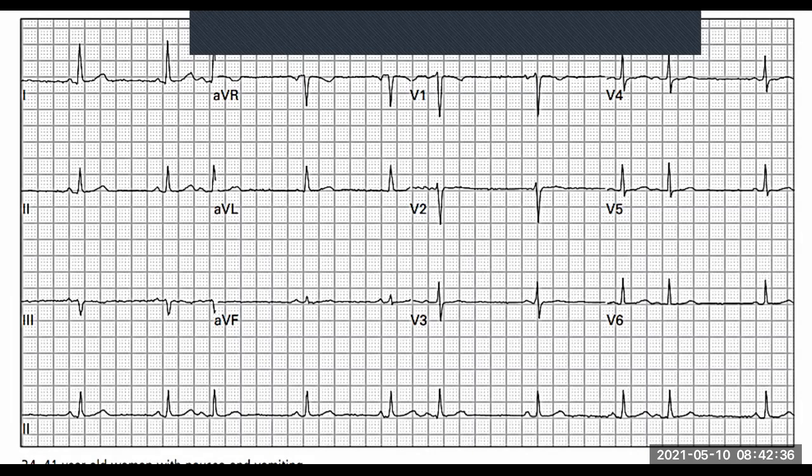Patient was involved in an MVA and hit their chest against the steering wheel. Then you know, listen, this is direct trauma. Patient presents also with a history of chest pain. She's very overweight. Then you know, okay, I could be looking at ischemia, all right? So remember, you don't have to diagnose everything off an ECG. An ECG is there to help you.